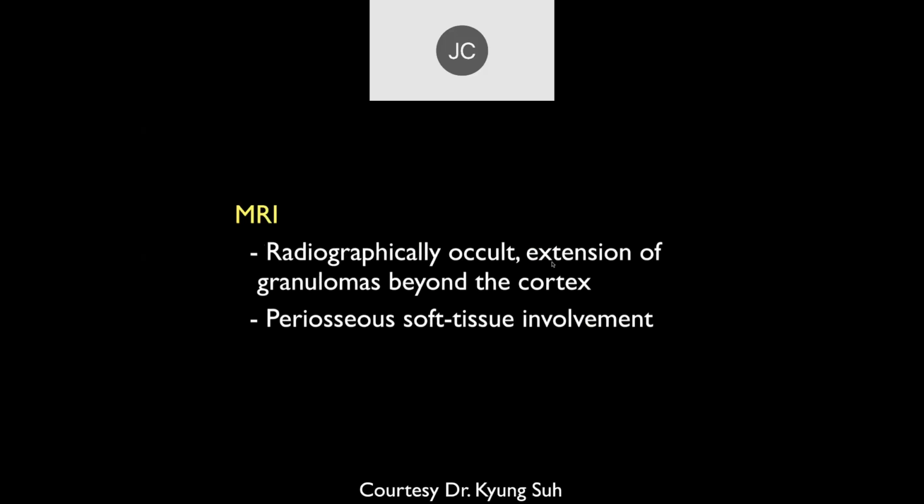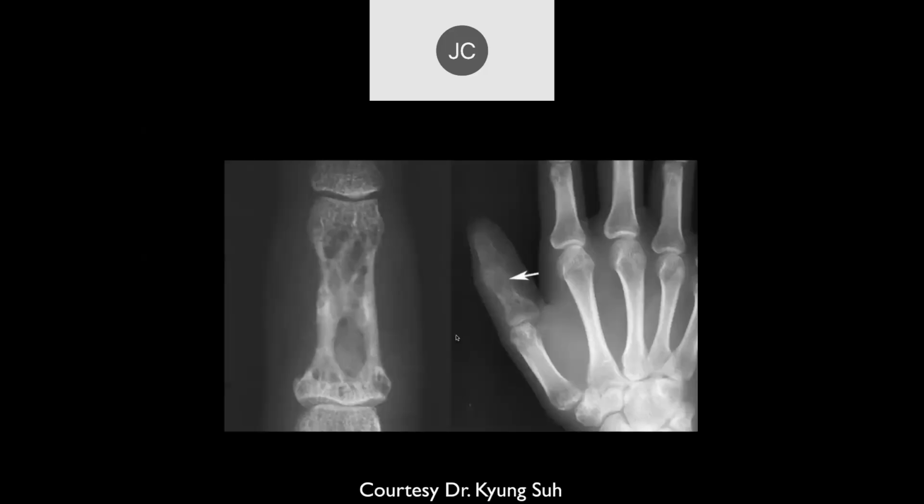And with radiograph or MR, you can just see inflammatory changes within the bone. This is the typical lace-like appearance on plain radiographs that you can see in sarcoidosis. We have focal areas where you have inflammatory disease within the bone that resorbs the trabecular bone, like we've been talking about, and you're left with these thickened trabecula in areas of resorbed trabecula due to the inflammatory disease of sarcoid.